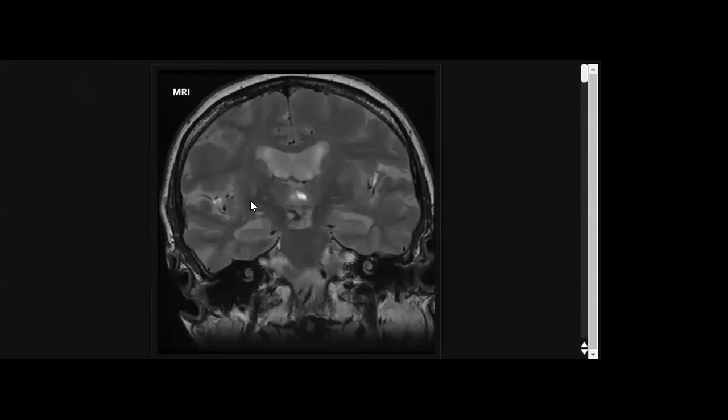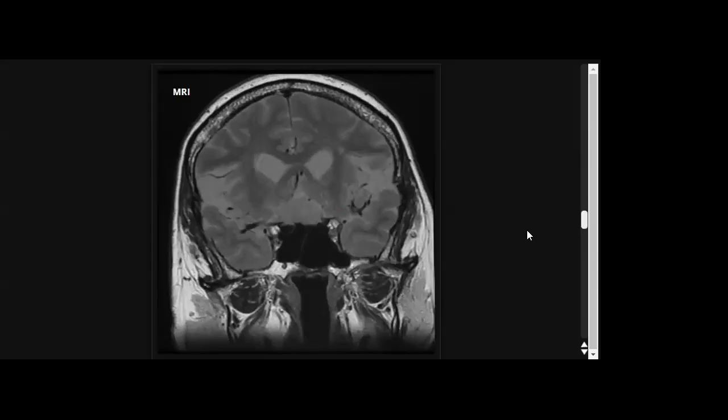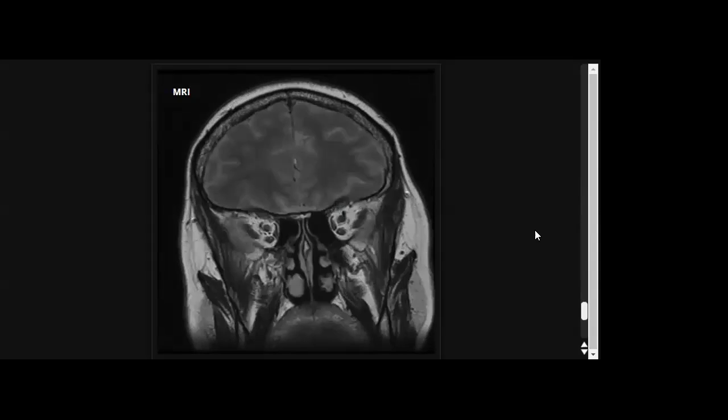I'm provided with MRI of brain, T1 weighted coronal sequence. I'm scrolling. I'm sorry, T1. Sorry, pair images. It's okay. It's T2, but not classic. Okay, let me continue, revise it. Okay.